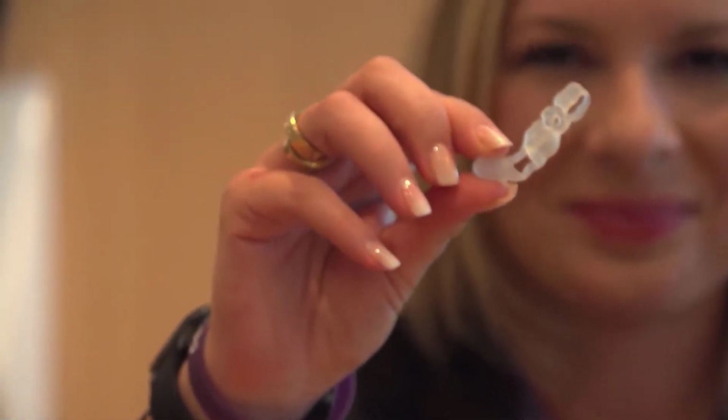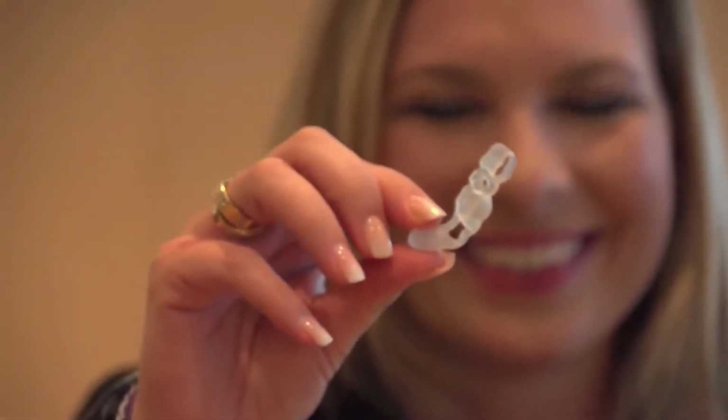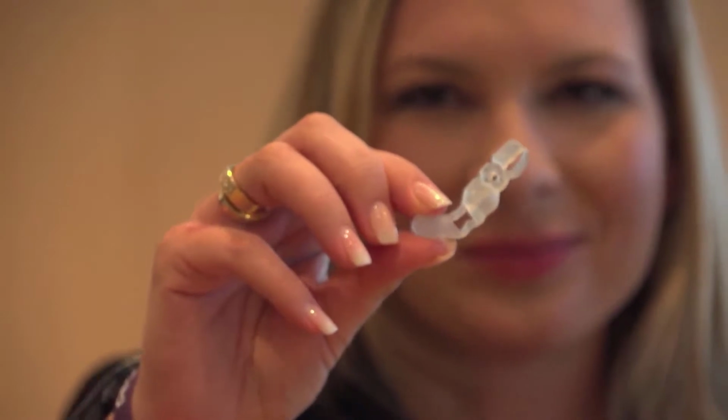Brilliant, thank you. So this is exactly the same design as I've just shown you live, where you've got an anterior window, you've got a horizontal posterior window. It's for this case, and the sleeves are actually, thank you Christine, very, very small. They're obviously different sizes from different places, and I will attempt to show you the sleeves.